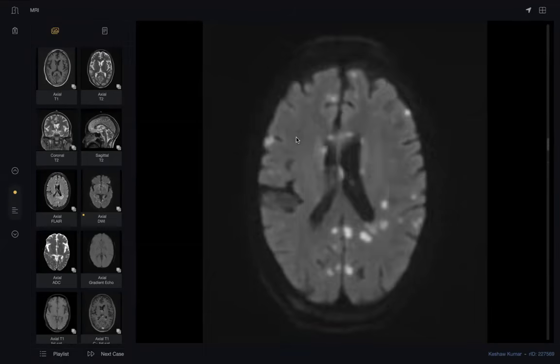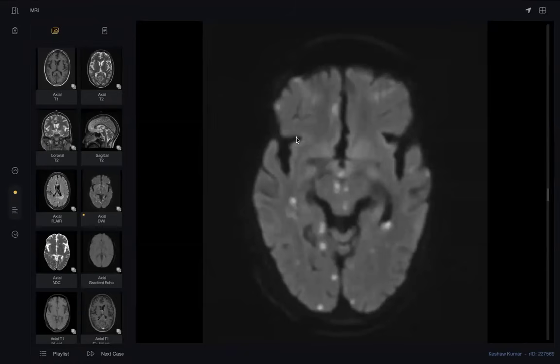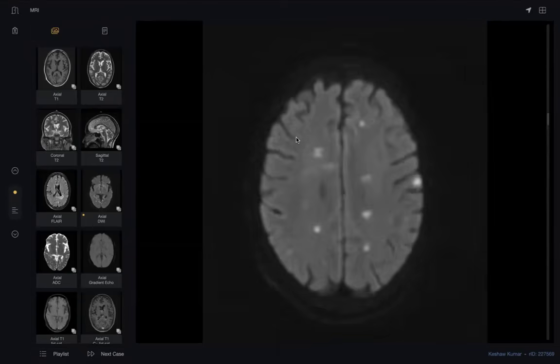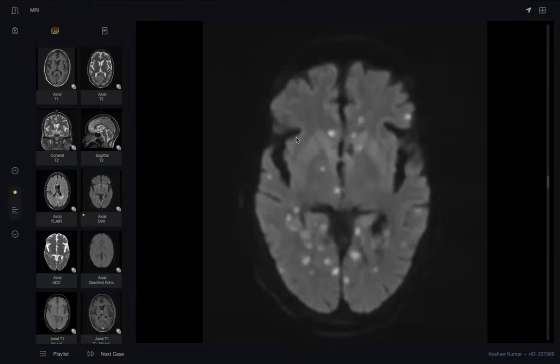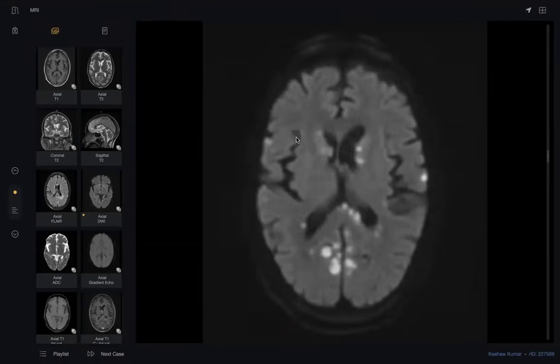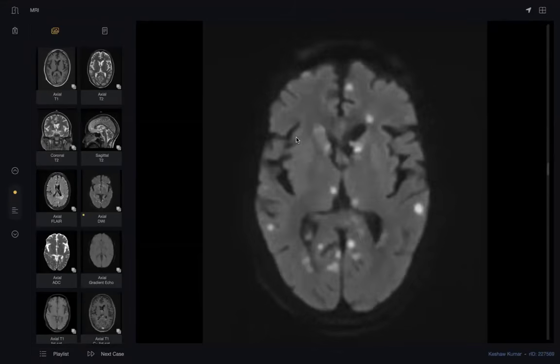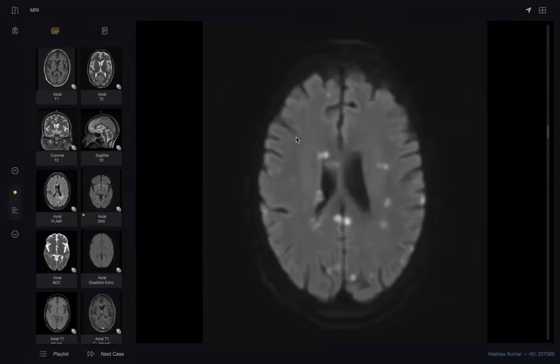TB, but TB will cause multiple... If I told you, AIDS maybe. Yes, excellent, excellent. So yes, he has AIDS. So what's your differential? The main lesions that come with AIDS, it could be TB. Why is it not lymphoma? I believe that lymphoma would be masses, not randomly distributed. What else? And also it could be cryptococcosis. It could be toxoplasmosis.